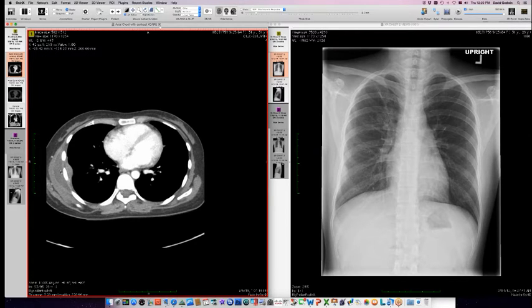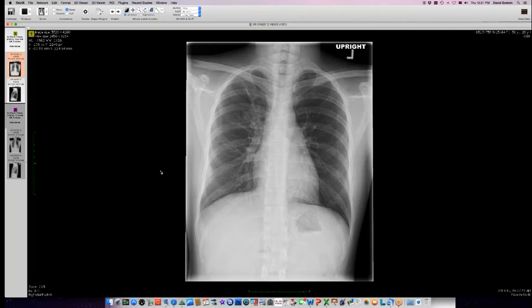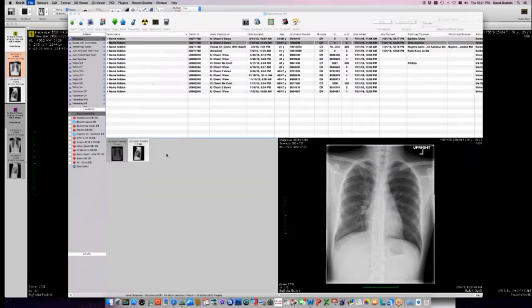Then Julie Takasugi from the VA had shown me a case years ago of a subpectoral late tuberculosis finding of fluctuant mass under the pectoral muscle on the right, and that was also a recurrence of TB from adjacent pleural focus. So this happens. This is the third case I've seen of this phenomenon. So let me show you this other case now.